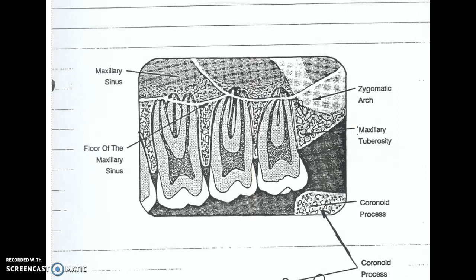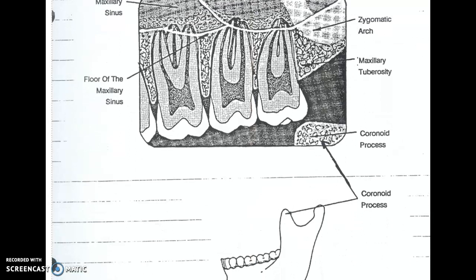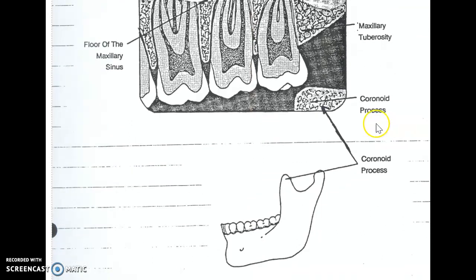But depending on how you have the patient biting for a maxillary molar shot, you might pick up the very edge corner of the coronoid process right in the bottom posterior side of that image. So if you ever see that question, what mandibular anatomic landmark could be present on a maxillary periapical, that's going to be your only possible answer, assuming your angulation is correct.